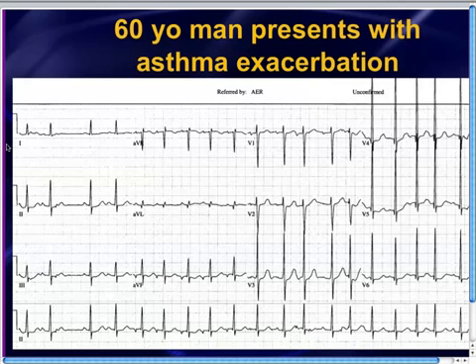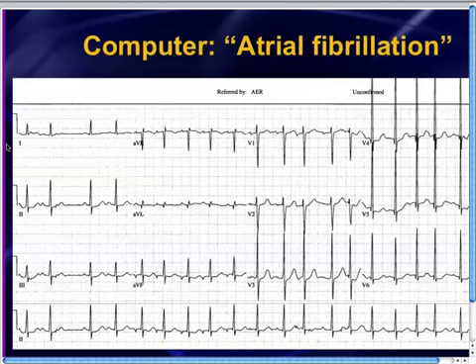And here's the 12-lead EKG. And what you notice is that it is irregular. Now, if you were paying attention last week, hopefully when you see something that's irregular, you've gotten paranoid about it and you've gotten your calipers out and you're marching these things out just to make sure that it truly is irregularly irregular, because if it's regularly irregular, then you're going to be thinking about PACs or you're going to be thinking about MOBITs. And when you map this one out, it actually is irregularly irregular. So the machine helps you out here because the machine calls this atrial fibrillation.